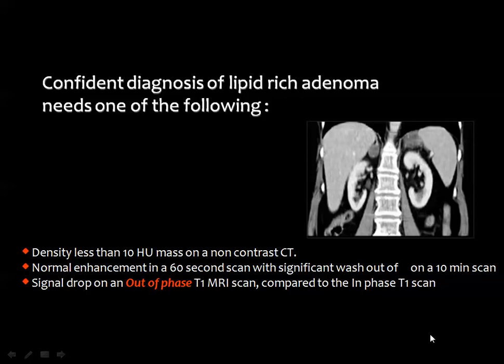This means that in order to scan the region of the suprarenal gland by CT, first you have a scan without injection of contrast medium. Then you measure the density of the suprarenal mass in the pre-contrast scans, inject the contrast, and measure the density of the gland after contrast injection.